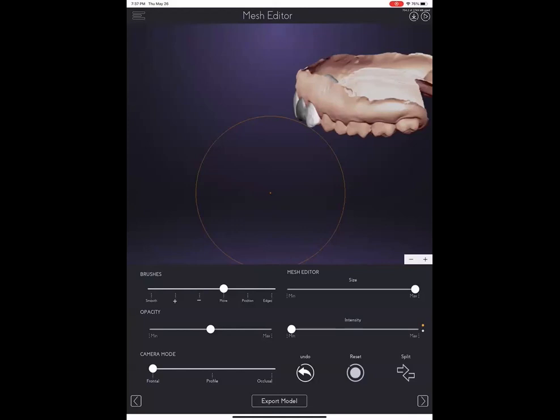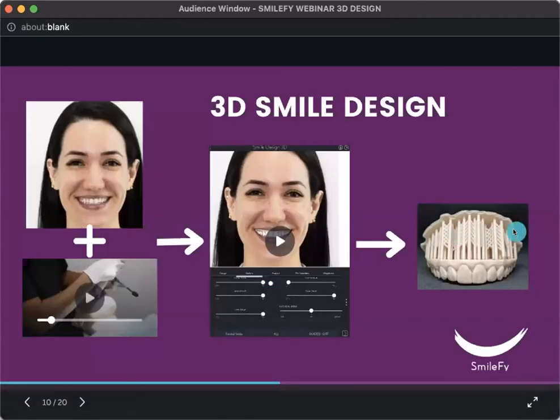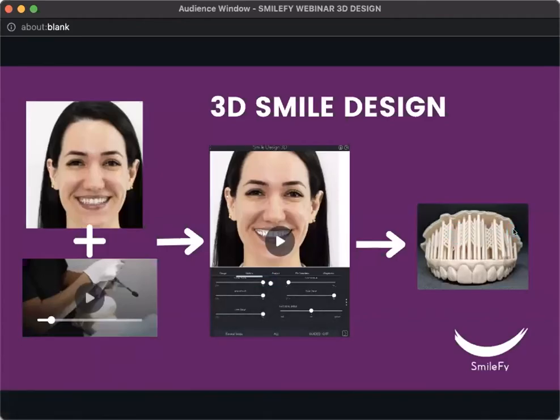So if you do have 3Shape, Medit, and have one of these 3 printers, you will have a direct connection from the beginning to the end. But what if you don't have one? Totally fine. You will simply export it to a Dropbox, Google Drive, and then send it to your 3D printer app to 3D print. So here, I'm done. From here, what is the next step?